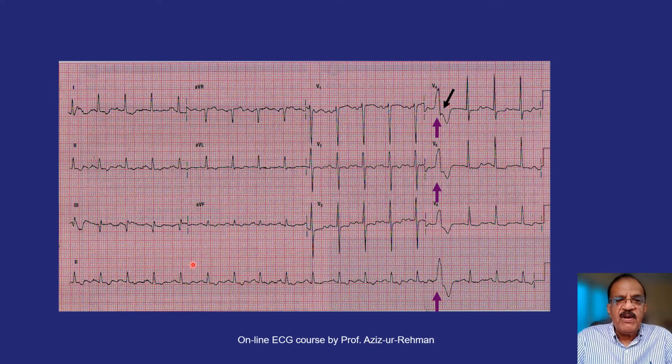Now this is actually a ventricular premature beat, as I will soon show you. But these small notches which follow the QRS complex and coincide with the expected P wave are normal P waves. In ventricular premature beats, since ventricular depolarization never goes back to the atria, as far as atrial rhythm and sinus node activity are concerned, it is as if nothing happened. There was an ectopic activity arising from the ventricles which depolarized the ventricles, and while the ventricles were depolarized, the sinus beat came. It did not penetrate into the ventricles because they were already depolarized, so it only manifested as a small P wave, not followed by a QRS complex.